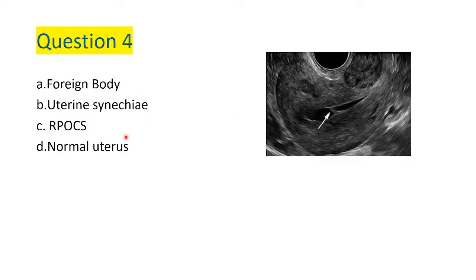RPOCs, which are retained products of conception, no, this is not retained products. A normal uterus? That's definitely not a normal uterus. This is an abnormal uterus.